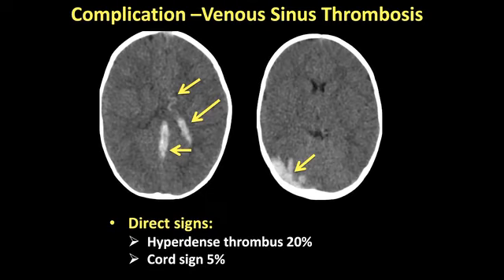Remembering what I said to you in the beginning, you need to know the age of the child post-delivery, because in the very early neonates you should not confuse hemoconcentration or fetal hemoglobin with thrombus. That's why giving contrast is very important.